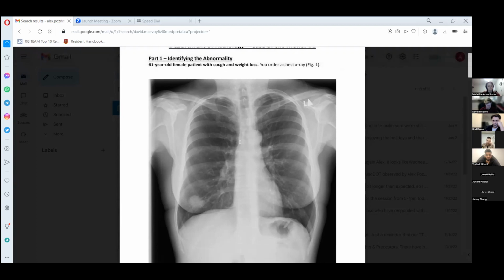We also have the mediastinum, which includes the trachea here, which you can faintly appreciate as a dark, more like a lambda-shaped, like Greek letter lambda kind of structure, or like an inverted Y, if you think about it. So here, the bifurcation point you can see here, that's the carina.